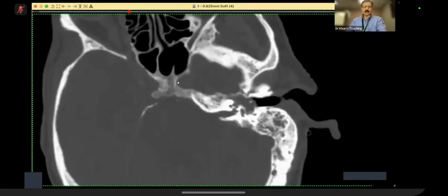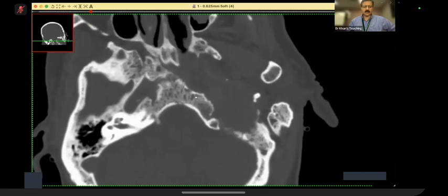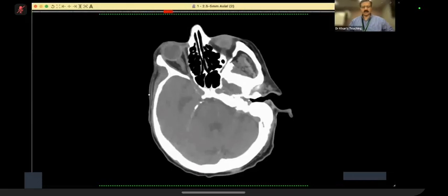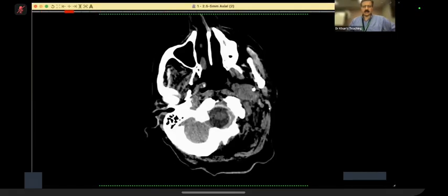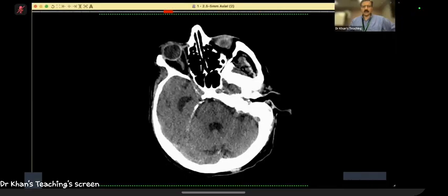And now, this patient, by the way, had renal failure, also had a pacemaker, and the patient was okay except for these symptoms, refused any other imaging. But even here, we can see what it is. In these kinds of cases, the VIVA will be all on anatomy. So you remember this. Even if your diagnosis is absolutely correct, the VIVA is going to be anatomy.